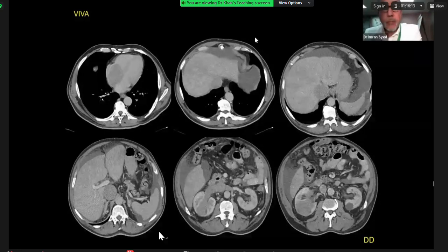Okay, good. So as you say, you've got a large renal mass arising from the posterior interpolar region of the right kidney. Remember, be descriptive, very important. It's causing blunting and local mass effect and splaying of the calyces, and there is extension into the right renal vein, IVC, and possibly retrograde involvement into the left renal vein, which is important. The IVC is distended. The IVC inside the intrahepatic region is also dilated. There is free fluid seen anterior to the liver, and there is right atrial invasion.